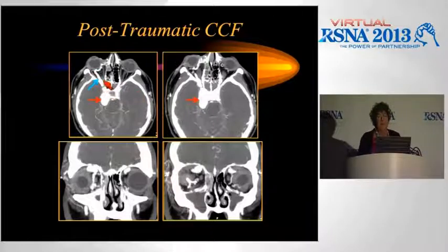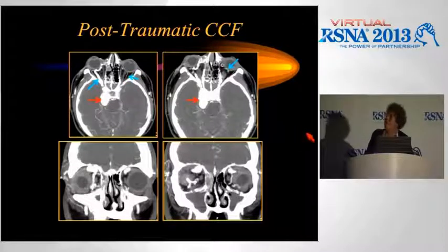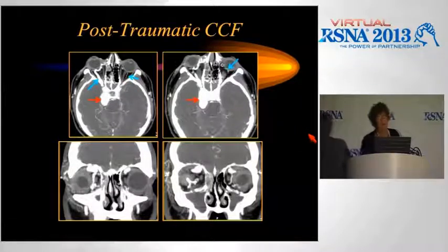So here you clearly see a very large superior ophthalmic vein, but if you look at the other orbit, you see there's other vessels floating around in here that you normally do not see in the typical orbit. Now you have to get really worried. And when we look at the coronal views, we see both superior ophthalmic veins are enlarged, right greater than left.